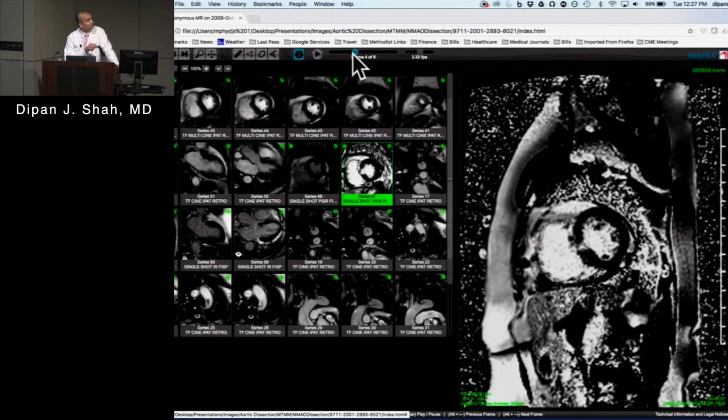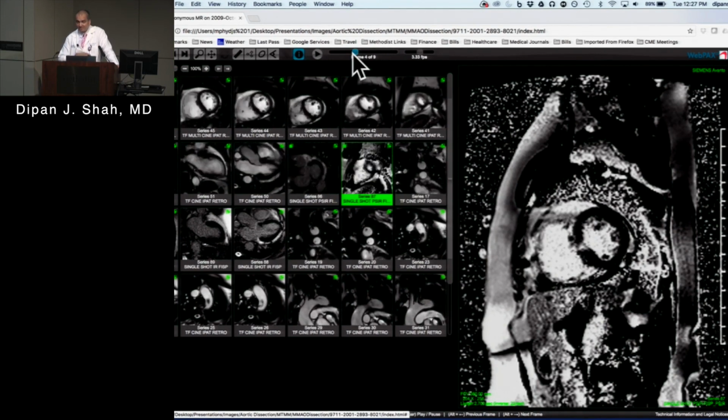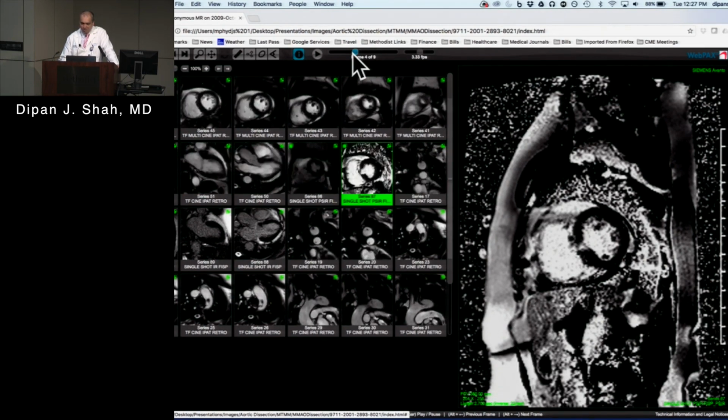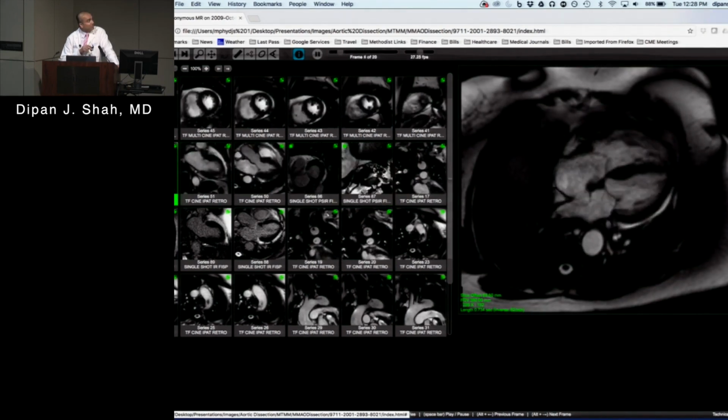Okay, so the other interesting finding on this case is if we look at the delayed enhancement MRI also, you notice there's a little area of hyperenhancement right there in the septum, consistent with infarction, all right? And so, what's the territory here? This is like an isolated septal type location. So again, all of this probably fits with, and also if you look at the CMR, there's certainly an aneurysmal septum.